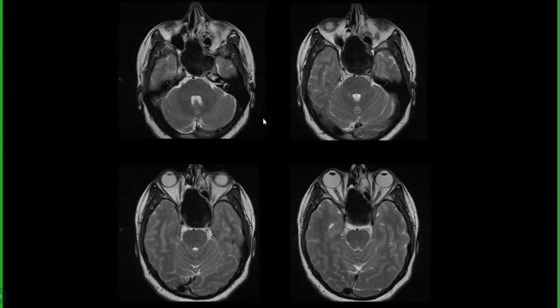We can think of sinusitis. It can be sinonasal carcinoma. It can be any mass arising from the sphenoid. Then mucocele or mycetoma, fungal mycetoma. These are the common DDs that we can expect in a lesion like this.